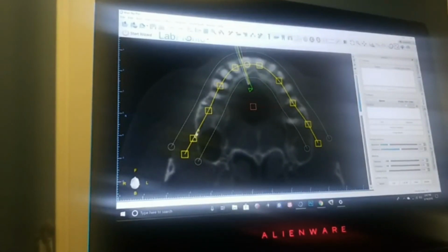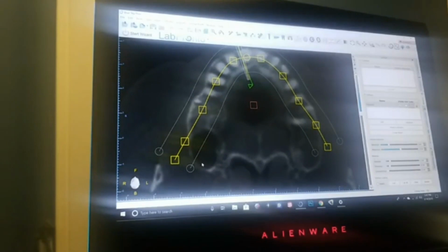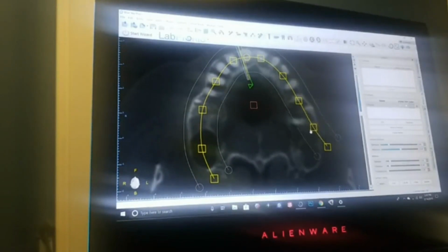Now, the map that you have done previously was for a mandible. Mandible and maxilla don't match. It's completely different anatomy. So now you have to work this out to match your maxilla. So now I'm going to take these squares and bring them in, and you can see in these other images, your panoramic images, the two lines that go on each side kind of follow you.